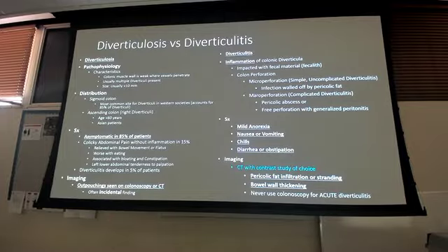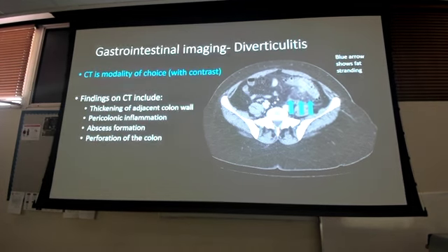You see that fat stranding and that bowel wall thickening. Here's an example of that. All right, I got my little air-filled areas. That's my outpouching, my diverticuli. And then look at my dark gray area in an area that's not inflamed, right? An area that's not inflamed and angry. And then look at this. This should all be just like this, but it's not.